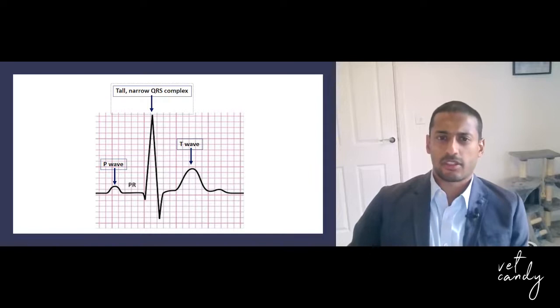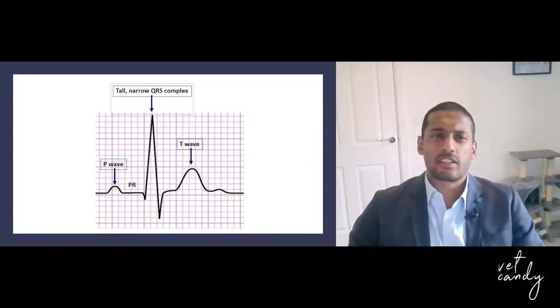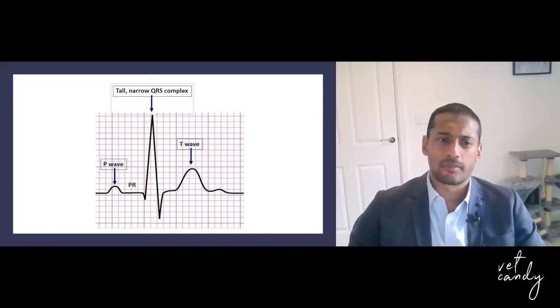It's a simple definition, but one people sometimes forget when confronted with an ECG. Remember that ECGs are essentially a graph of electrical activity over time. They can be pretty daunting, but there's a relatively finite manner in which the atria and ventricles can interact or not interact, and we will cover the important changes and arrhythmias now.